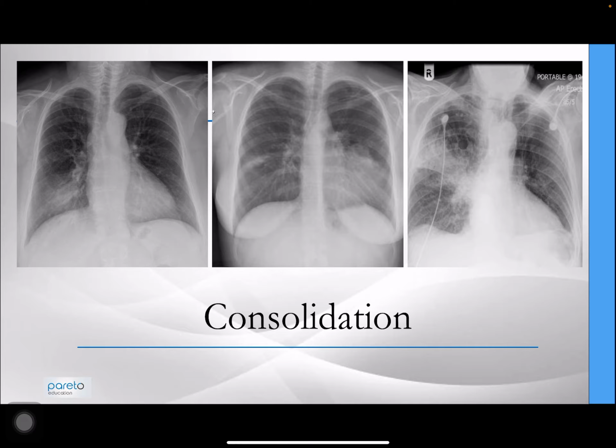right middle lobe. And it could be fluid, it could be blood, and this is where it becomes significant because consolidation by itself doesn't necessarily tell you what's causing it. So you need to find the cause. And hopefully you can start to put two and two together with the clinical picture in order to conclude what it's as a result of. So maybe a lower respiratory tract infection.